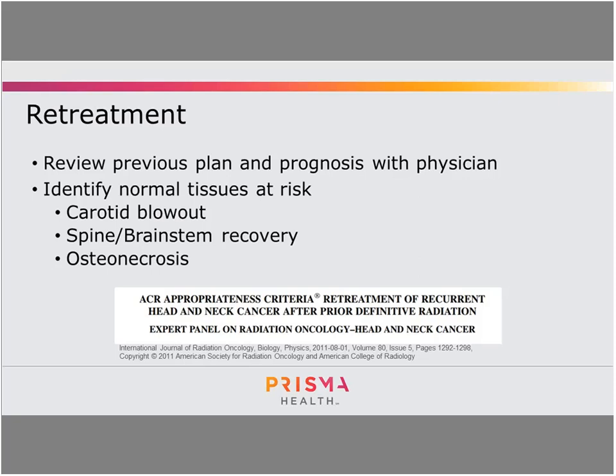So this is where going over prognosis with the physician versus risk from the dose that you're going to deliver is very important. And then also osteonecrosis. When you think of the mandible, this can happen from a single definitive treatment, taking your PTV up to about 70 gray. You can get necrosis in the mandible, and so keeping track of bone doses in these is very important as well, because those are things that typically end up requiring surgery.